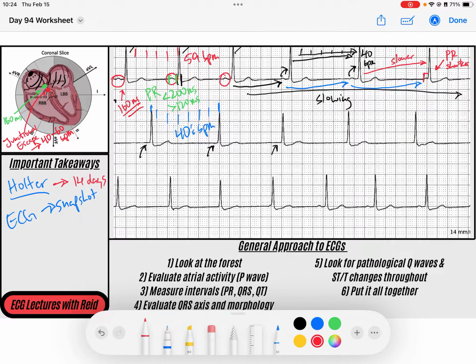And so what is actually happening here is when this person's sinus beats drop below their pacing ability by their AV junction, you actually see evidence of their junctional escape beats. And that happens for a few beats, right, as this person is taking a big breath in and out. And so the changes in their intrathoracic pressure is causing their heartbeat to slow down. Their sinus node slows down for, however long this is, 5 or 6 seconds.